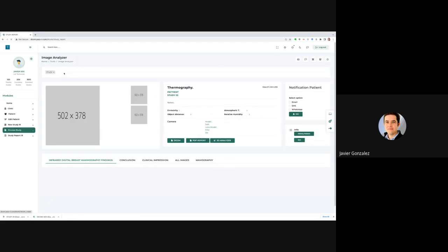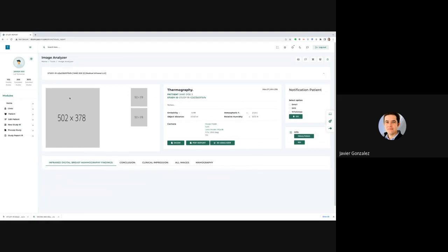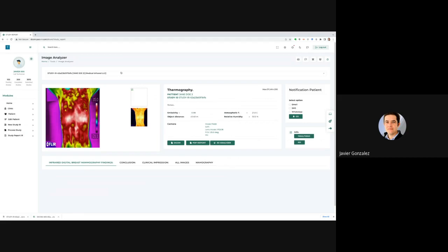I think we can do a lot of stuff with this, right? What was initially just a DICOM converter, we're now trying to make an all-in-one app where you can save and retrieve DICOM files, and you can do interpretation.